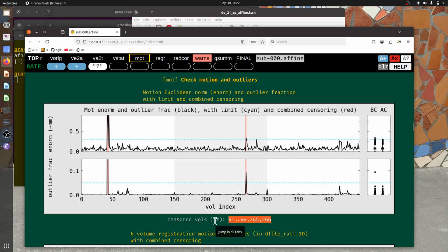It's at 1%. Now, there are some parts that are just below threshold, and what is the correct threshold level is really still an open question in the field. I'm not even sure that that's a well-posed question that can get an answer, but these are reasonable levels to start with. Ideally, our results wouldn't depend so much on the exact threshold level that was set.